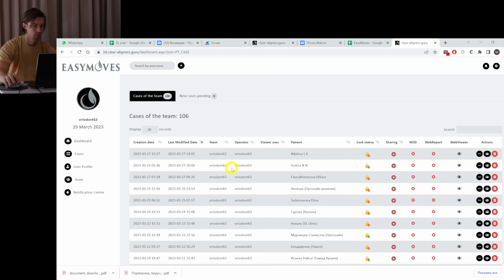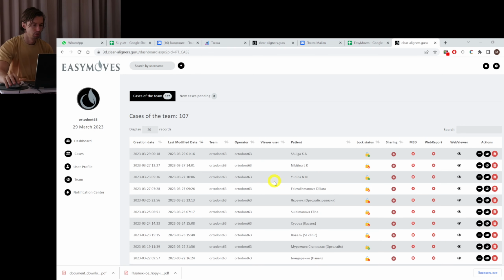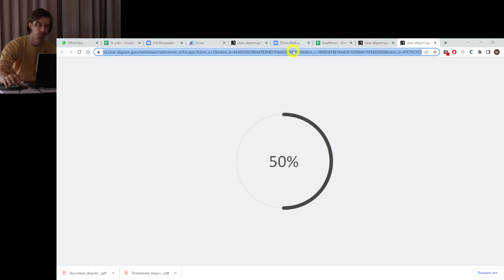Okay. Now we can refresh our dashboard, and we find the setup here. And we will send this link to our customer.